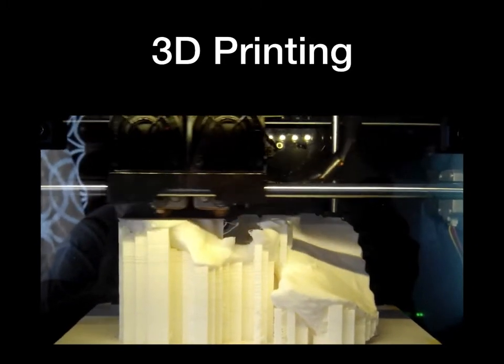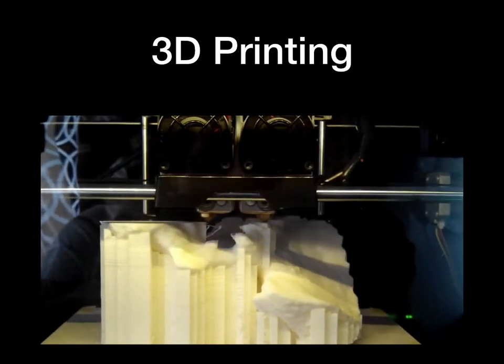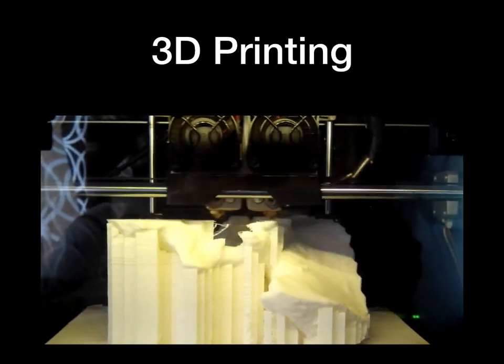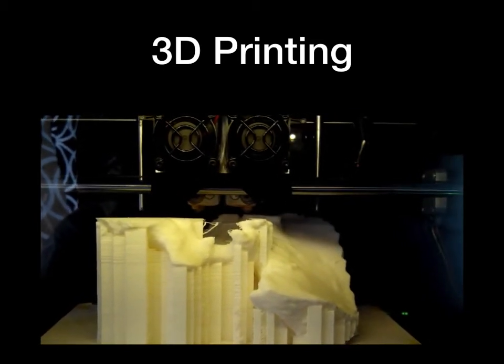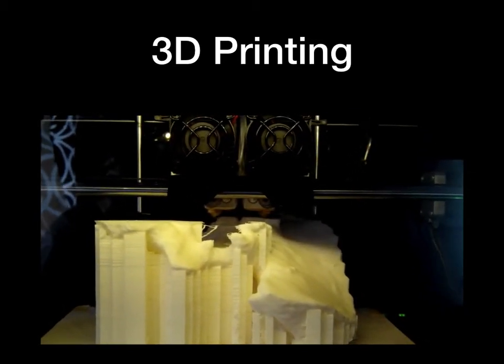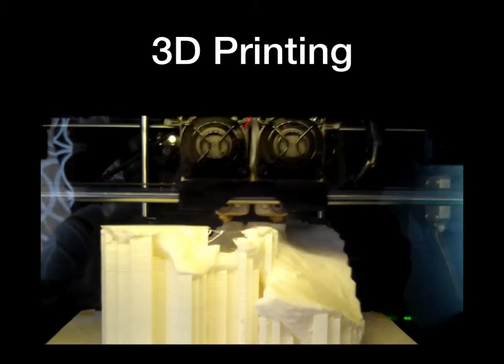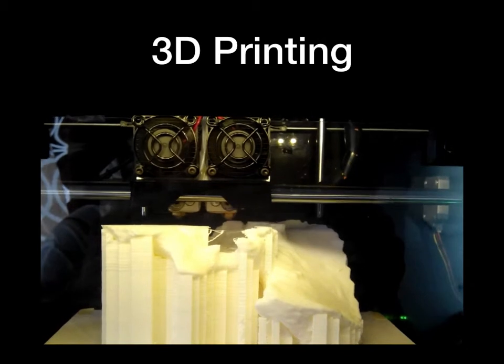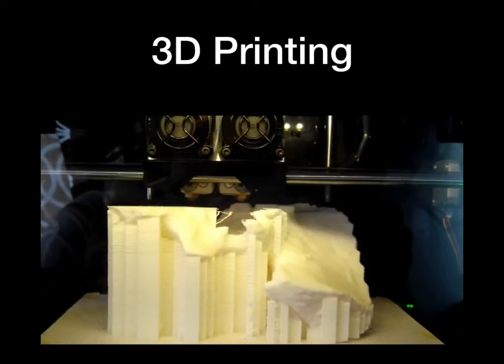You can see this is a fused deposition modeling version. It is printing an acetabulum. Beneath it are the supports, and this is the extruder which is spewing out the spools, which are heated, and they kind of replicate the CT images and deposit it layer by layer. So it's also called layered manufacturing.